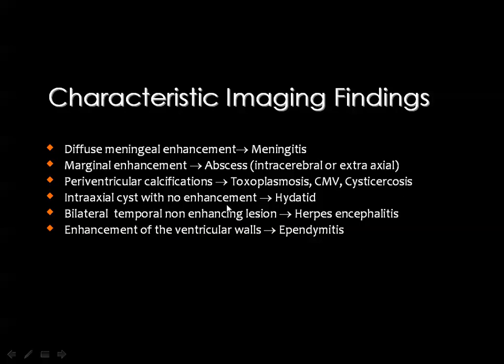Intraaxial cyst with no enhancement is usually diagnostic of hydatid cyst. Bilateral temporal non-enhancing lesions are highly suggestive of herpes encephalitis whenever the clinical picture can allow this diagnosis, and the enhancement of the ventricular wall is diagnostic of ependymitis.